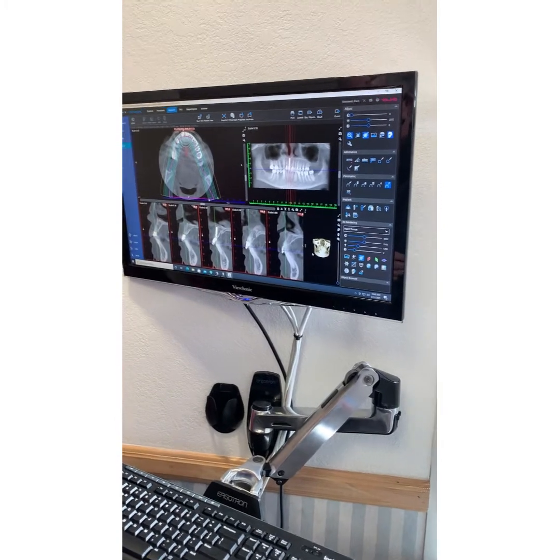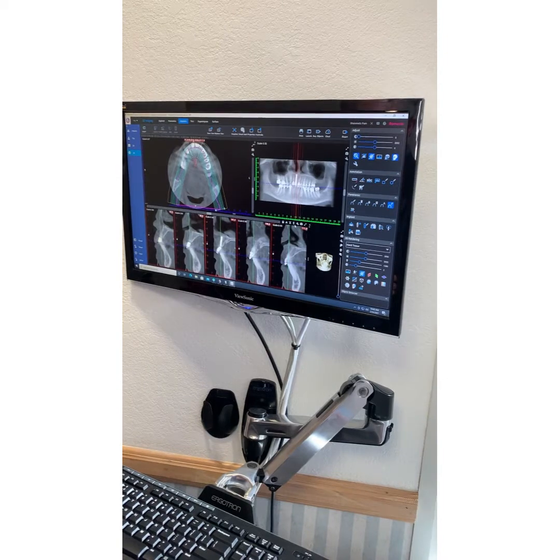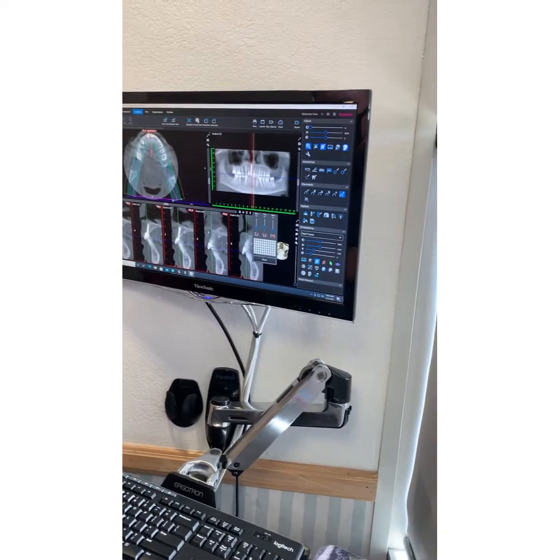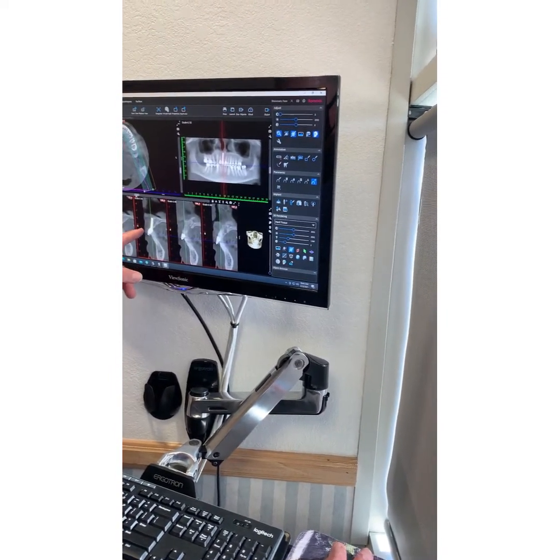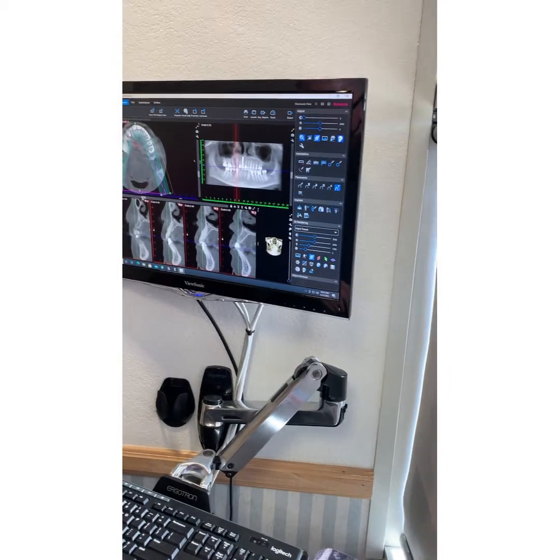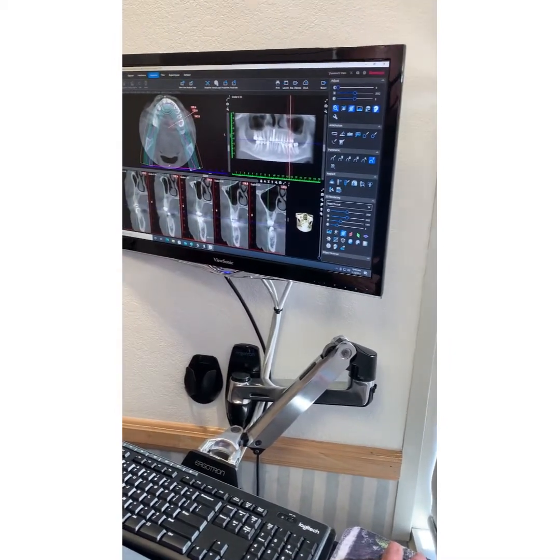Let's say we took the scan and now he just wants to check a tooth, an endo tooth. Can he focus on the one tooth? Yep. Watch this. I'm bringing all of these red lines, represented by these slices here. So I can now go through and find each tooth I'm looking for, and this will allow him to look through this and see everything he needs to see.